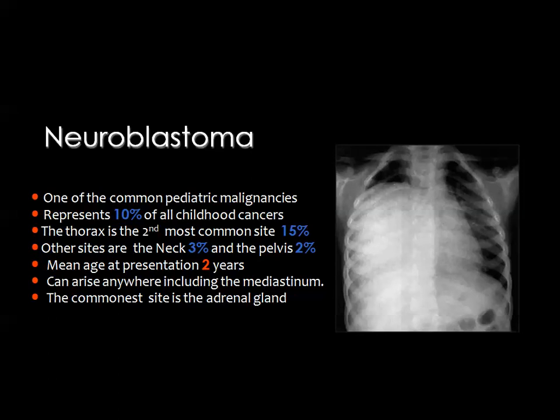When we discussed the diagnosis of pulmonary masses, we referred to the issue of neuroblastoma. Actually, the neuroblastoma is a mediastinal mass, but is frequently seen on imaging as a lung mass because of its big size, and most of the posterior mediastinal tumors look like pulmonary masses.